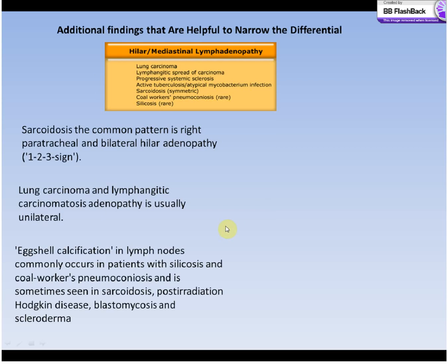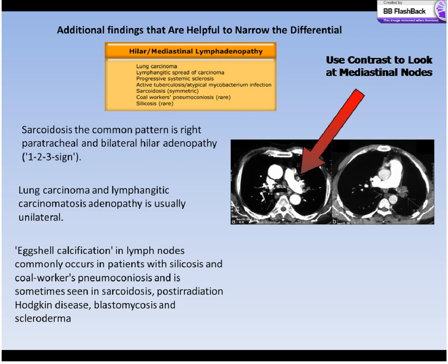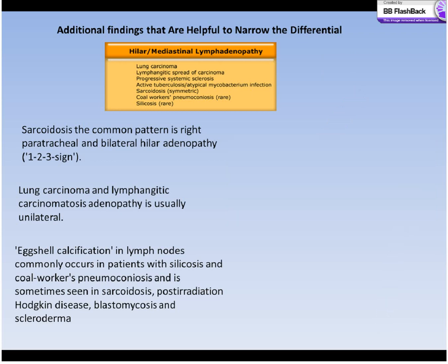And just some other associated findings. It's always nice to look at the hila, the mediastinum. Common findings we see there are lymphadenopathy, and things that cause lymphadenopathy are cancer, infections such as TB, sarcoidosis, and other occupational related pathologies such as coal workers or silicosis, even berylliosis.